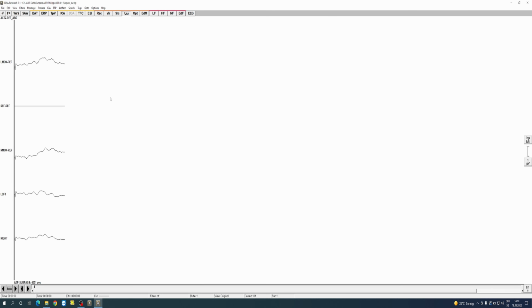So now we're looking beautifully at L-mon to ref, bipolar, ref to ref, zero line because it's ref to ref. R-mon to ref, that's the not stimulated ear, that's the masked ear. You may remember we put a masking of minus 30 decibel to the stimulated ear being 80 decibel, so this is 50 dB to prevent conduction across the skull if somebody had otosclerosis. We look at the left and the right bipolar channels. Again, we see the stimulus artifact, and that's beautiful.